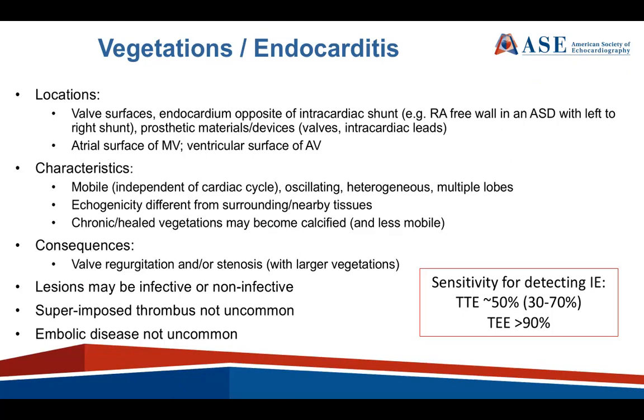that actually obstruct the valve. The lesions can be infective or non-infective, meaning if they've been treated with antibiotics for quite some time, they might be sterile. But we can see superimposed thrombus. And sometimes when people have septic emboli, it's not necessarily the remnants of the infective vegetation that's embolizing, but it might be thrombus on top of that that's embolizing.